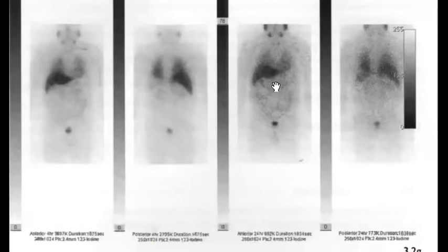You can see the liver has physiological uptake, and the right adrenal doesn't have uptake in the MIBG. The lack of activity in the right adrenal in the MIBG scan means this is unlikely to be pheochromocytoma, so it will be carcinoma.